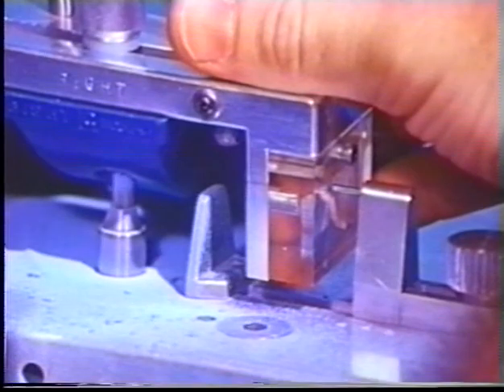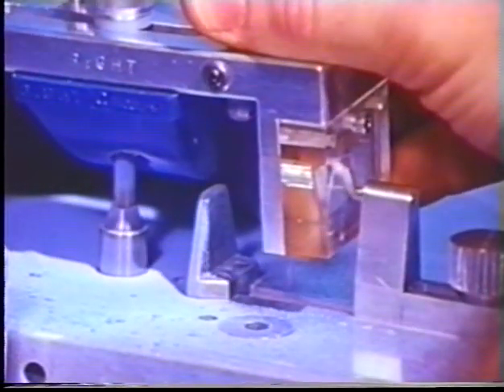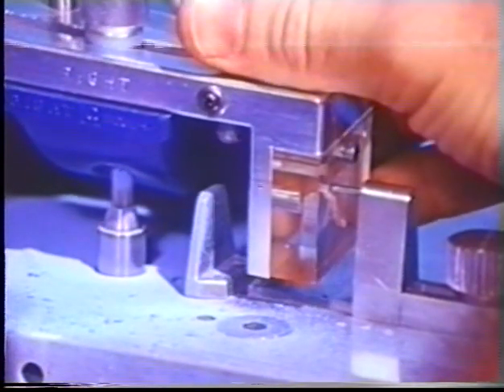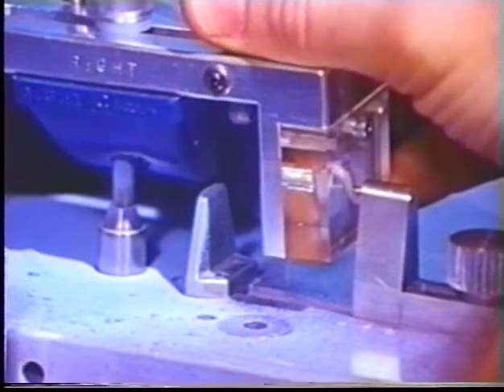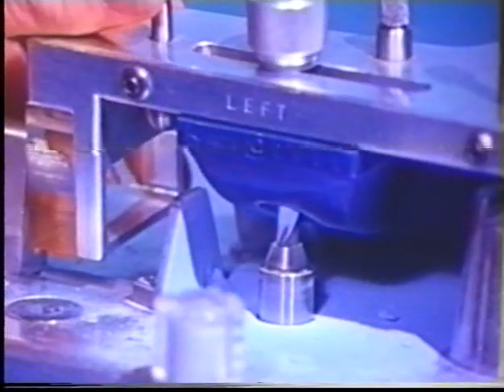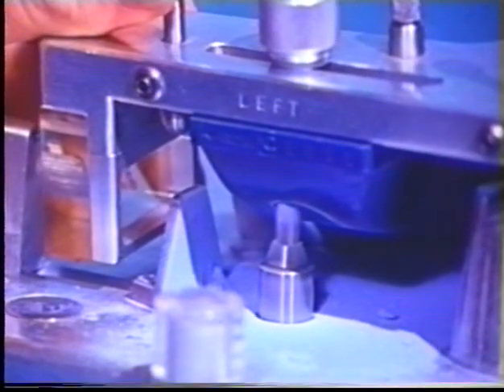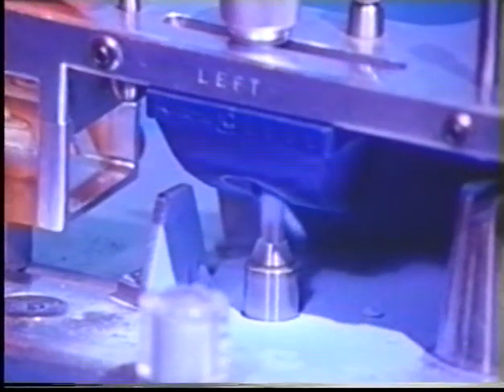Here we see the right recording with an analog being generated on the left. Note the backlash effect in the recording was caused by the pivotal action of the working condyle. Observe that the Bennett and orbiting paths are magnifications of the movements at the condyle level. A closer view of the recording shows the backlash effect. On the left, starting in centric, we see the lateral and medial Bennett shift of the working condyle, followed by the curvilinear Bennett and orbiting movements.